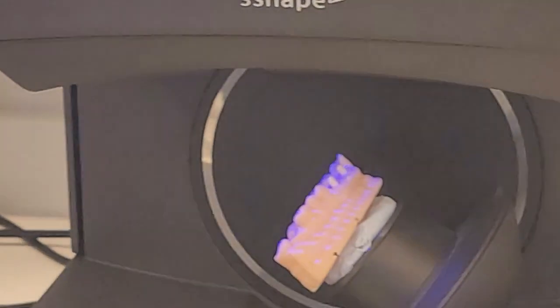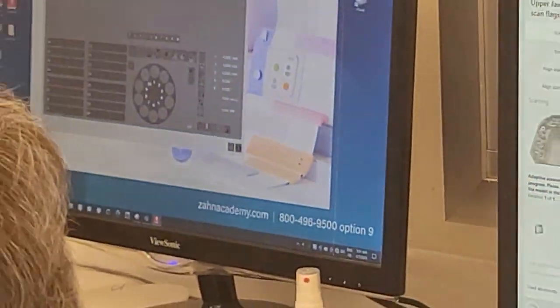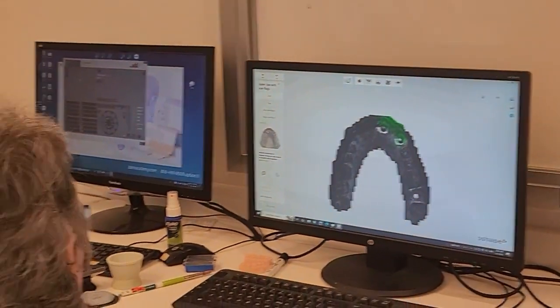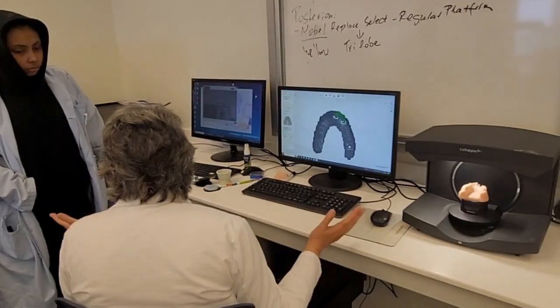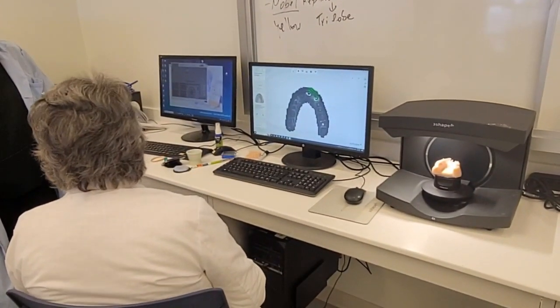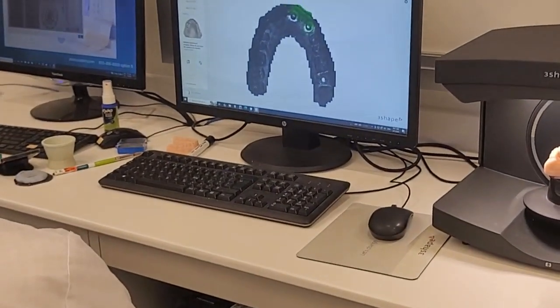Abutments by hand, right? Especially for a bridge. You know how hard it is to make them parallel, right? And you know, you can use a surveyor to do it. And that's a step that you shouldn't miss. Nobody should miss that step, right? But designing here, it's pretty easy because the software does that step for you, okay? So you're gonna see when you do the design.